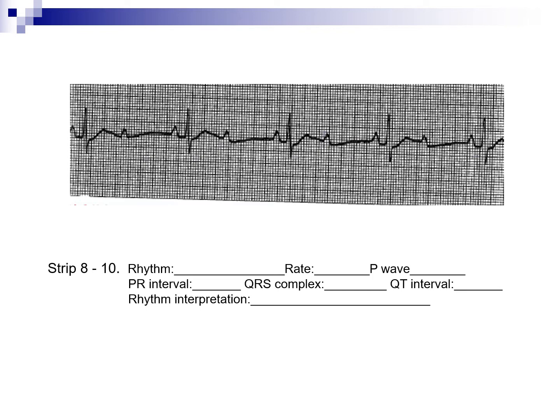In 8.10, the rhythm is slightly irregular. If you look at the ventricular, it's off by just 3 boxes. If you were to look quick, you would say it probably is regular. Your atrial rate is regular, and your rate we're going to say is about 30s. You do have P waves. You have more P's than QRS's, and we're going to call them sinus.